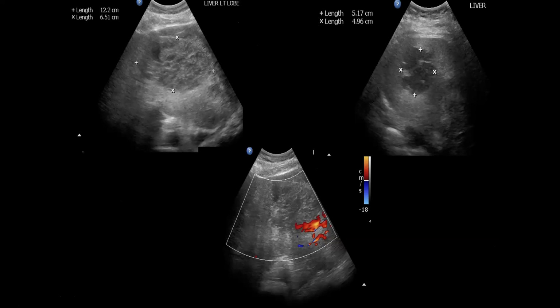Liver abscess morphology depends on the age of the abscess. Initially, the abscesses start as regional cholangiohepatitis, which is regional inflammation without any liquefaction. Then it can have a mass-like structure before liquefaction. Then as it develops, you can see these tiny small locules or cluster of small locules adjacent to each other, and with time they can fuse together and form a larger cystic component. And if you give it more time, it can look like a simple smooth walled cyst. So the imaging of a liver abscess or any abscess in the body depends on the age of the abscess. Initially it can look like solid.